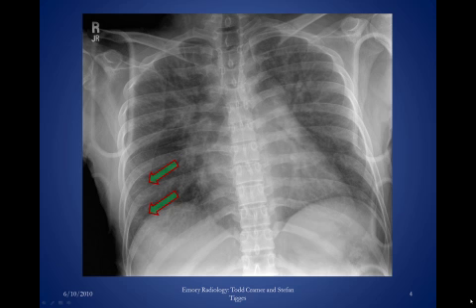Patients who experience repeated bouts of edema may fibrose their interlobular septae, causing permanent thickening. Therefore, Kerley B lines may remain even after the clinical heart failure picture resolves. In that case, these lines would be called chronic Kerley B lines.